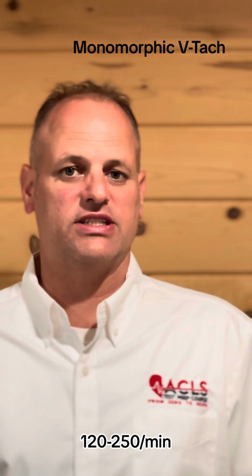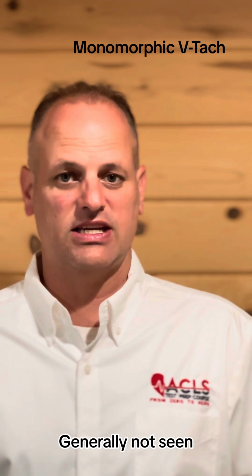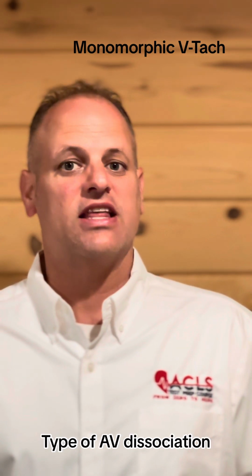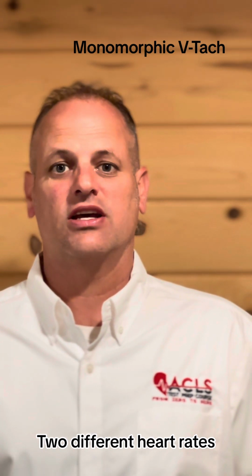Now, in terms of the rate, 120 to 250 times per minute. Generally speaking, if it's less than 120, they call this slow V-Tach. P waves are present, but generally speaking, you're not going to see them. And if you do see them, you're going to see fewer P waves than QRSs. This is another type of AV dissociation where you actually have two different heart rates.